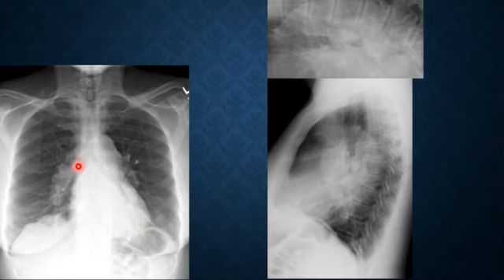Another example, you can see here big hilum bilateral. Okay? When you take a lateral chest X-ray, you can obviously see. And I hope today when you go into the routine imaging, when you see a suspected mass or something, do a lateral chest X-ray and look for a binocular sign or donut sign or bagel sign or whatever makes you hungry sign. Well, I love donuts. Anyway, now a more famous sign, that is the figure of 3 sign.